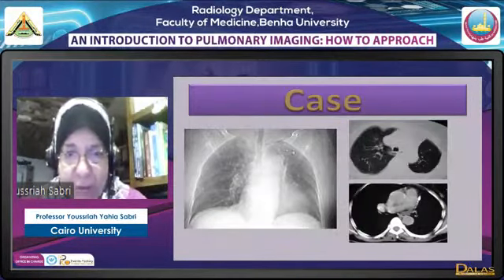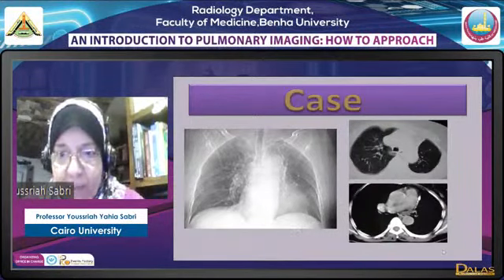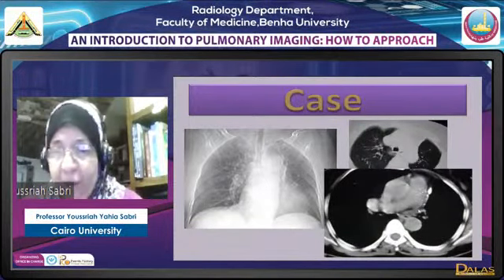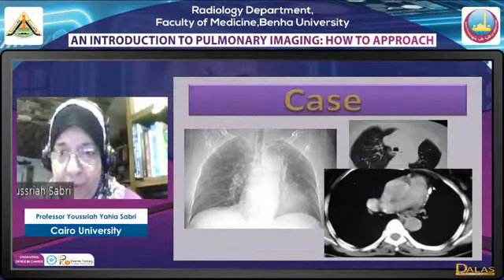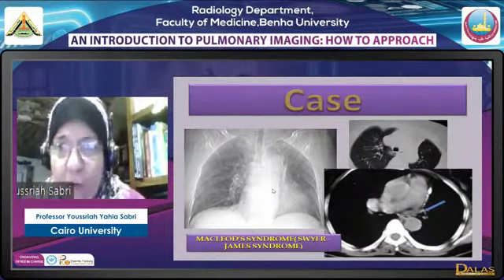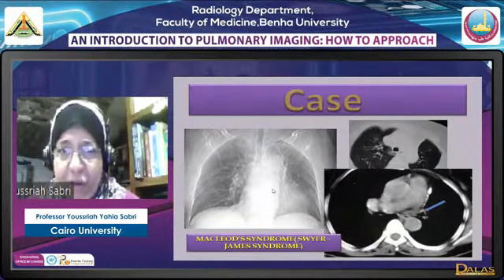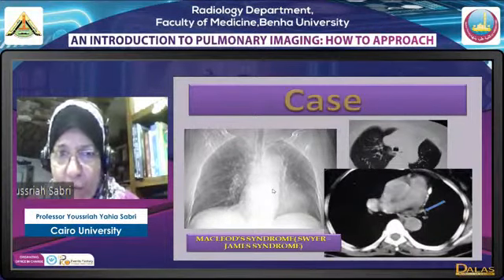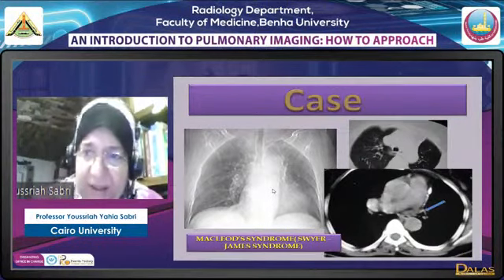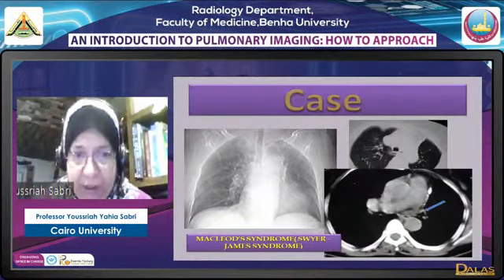Now here we have a small lung also, hyperlucent lung, but if we look here, there is nothing wrong with the configuration of the mediastinum, the heart, and there is a normal pulmonary artery, but it is a rather small artery with some calcification noted. This appearance actually we see in Macleod syndrome or Swyer-James syndrome. What is this? Well, it's not a congenital condition. It's a patient having, very early in life, severe unilateral chest infection or bronchiolitis, okay, and then the lung becomes later on small with a small vessel supplying it because it's not functioning properly.